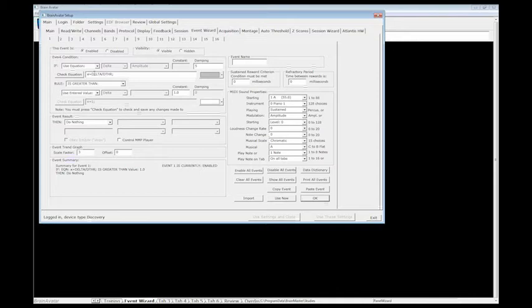One, which is this one, and I'll go more into detail on events and things like that in the third one, which is going to go over Event Wizard. But I just want to show you the events that are in here. It's the delta divided by delta threshold, theta divided by theta threshold, plus alpha divided by alpha threshold. You've got a high beta divided by high beta threshold. You've got a points divided by 100.